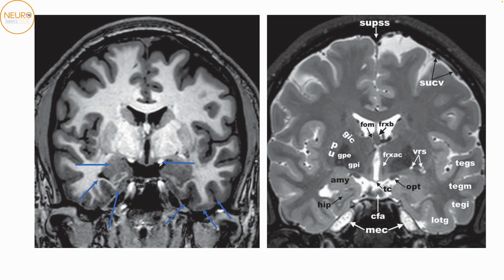As we go posteriorly, we can make out now that we can see the temporal horn. The temporal horn on its floor will develop a grey matter collection that is known as the hippocampus. So we're not able to see that yet. Even though the temporal horn is visible, the hippocampus is still not visible. This here is a temporal stem, and this here is the amygdala, temporal horn. This is the entorhinal complex over here. This is the optic tracts.